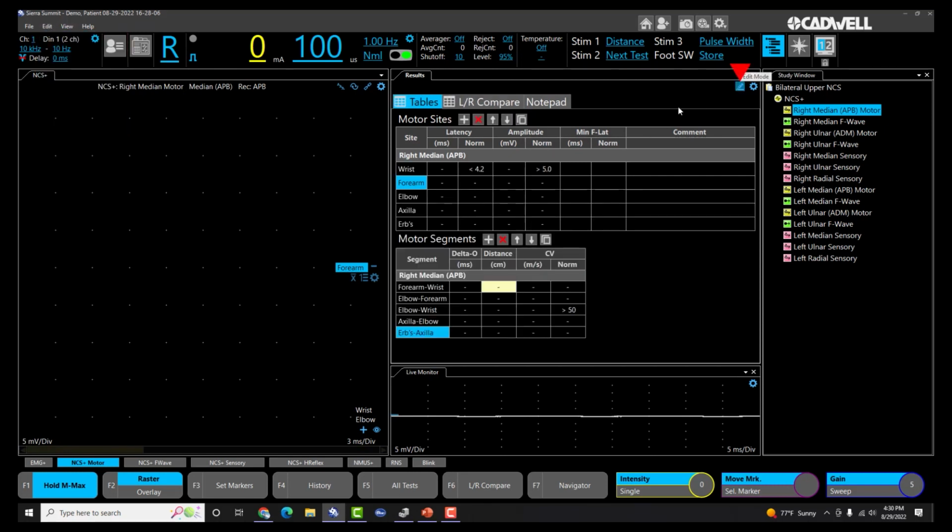You can use Edit Mode just to make a one-time change. If you don't do that last step of Edit, Save Test Parameters, that change won't be saved for the future exams.